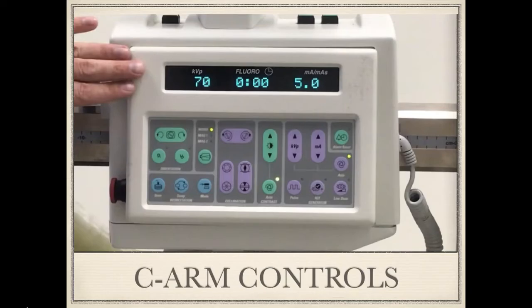Now let's move to the next section, which is this one. This is the section which has the magnification button. That defaults to normal magnification, and below that there are two more options, which are mag 1 and mag 2. When you press this button again and again, it changes from mag 1 to mag 2. You might need to magnify images if you're looking at smaller anatomy, or if you are doing fine work like passing in guide wires and you want to see them clearly. So that's when we use this button.